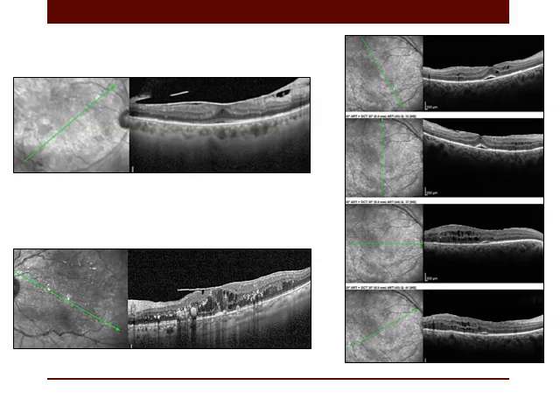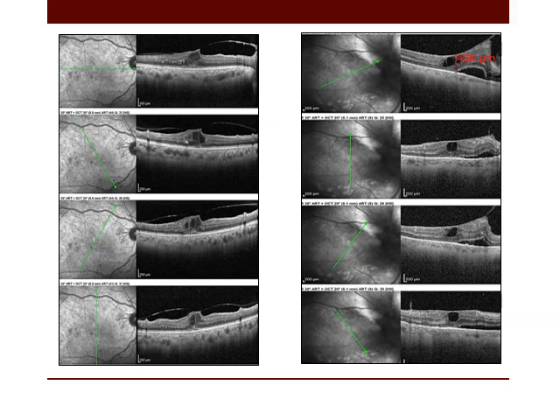Patient with central involving cystic thickening. However, we have a tightly adherent epiretinal membrane that exerts tangential traction over this area. Opposite nature again. Patient with vitreomacular traction, evident vitreomacular traction underlying cystic changes that are mostly due to vitreomacular traction and not due to diabetic changes. Another patient with anteroposterior traction underlying elevation of the retina, a tractional retinal detachment that is nearly threatening the central fovea, if not involving parts of the fovea yet.